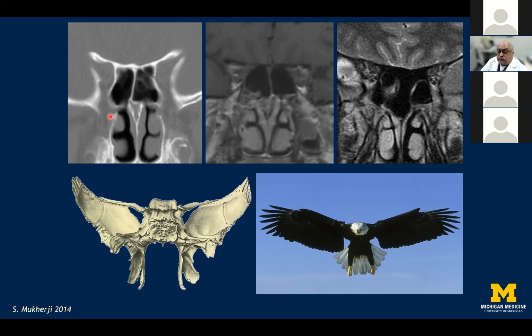This is important so that you can understand the anatomy of how the structures are arrayed there, and how intimately both the foramina, or sometimes called the fissure, are actually related to each other as far as the egress of structures from the intracranial compartments to the orbits and to the rest of the inferior portions of the maxillary region of the face is arrayed.